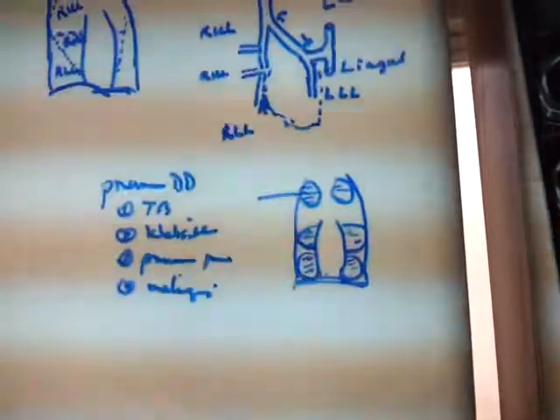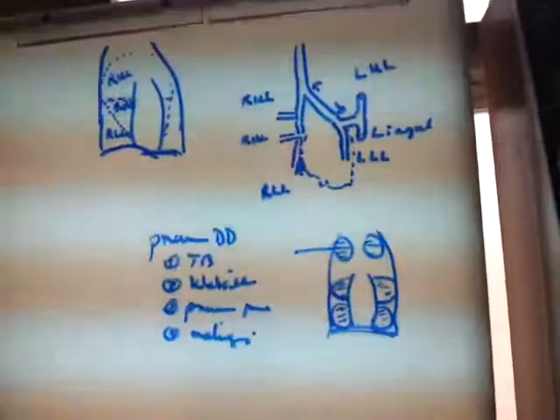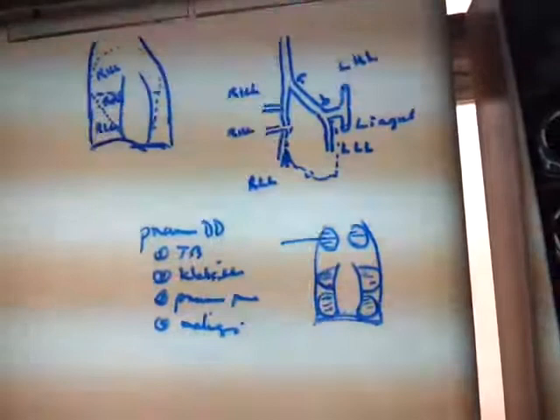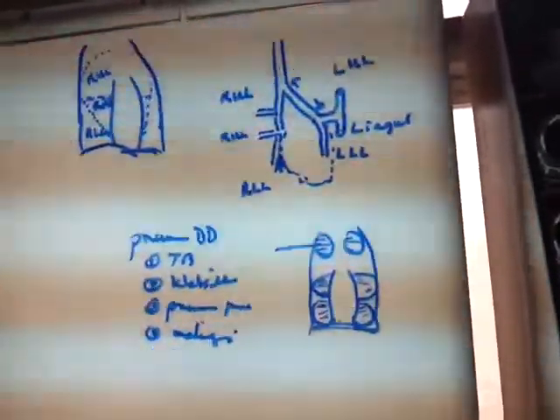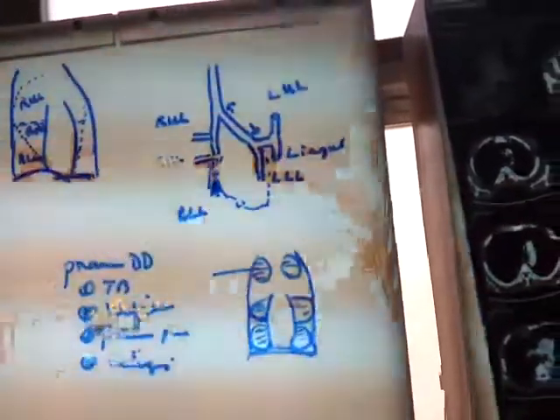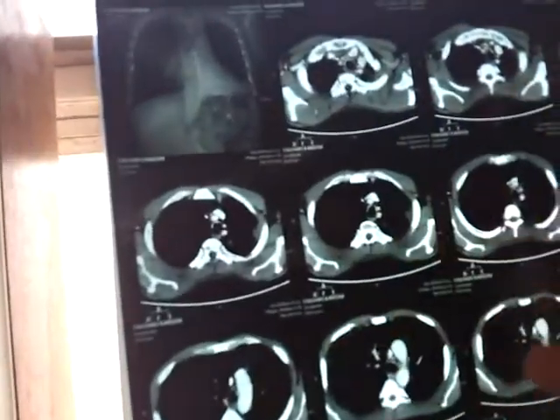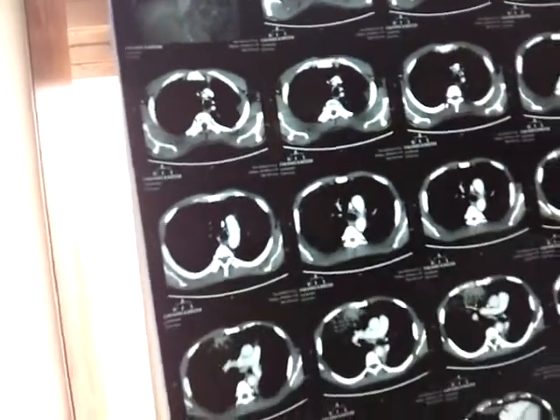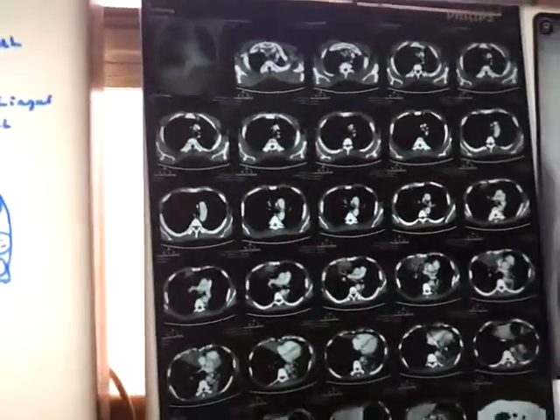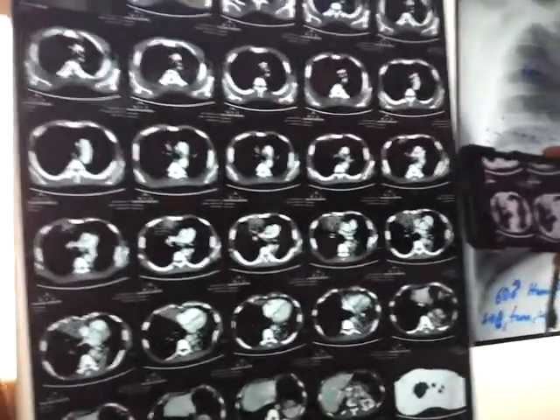This is a pneumonia. In this patient, a simple pneumonia, but severe because it's affecting two lobes. And still we are looking for tuberculosis in this patient, because first of all he is elderly, secondly he has fibrosis in the left apices, thirdly he is a smoker, and he has comorbidity that might be affected by tuberculosis.